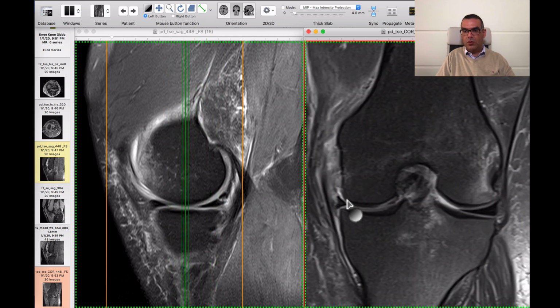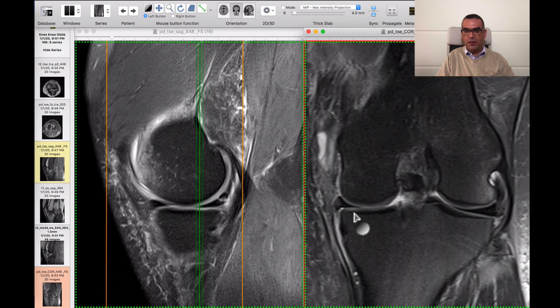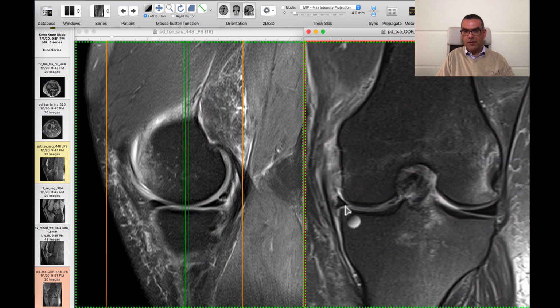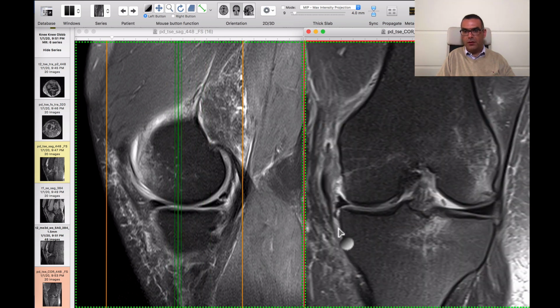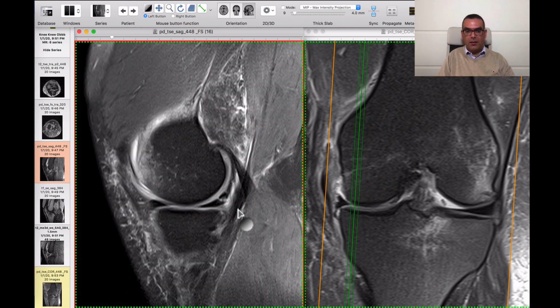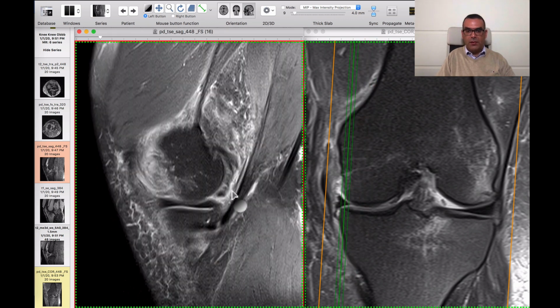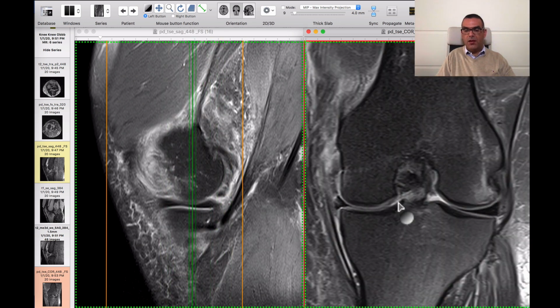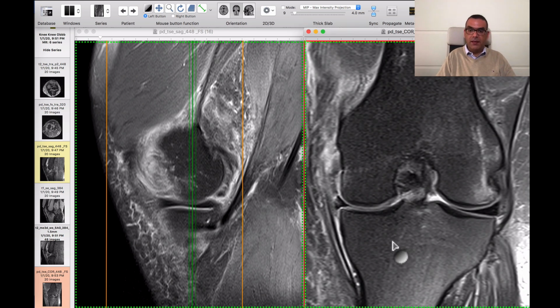And you don't see the meniscocapsular attachments of the body very well, especially the superior one. So there is an abnormal signal at the meniscal body. This is the inferior meniscocapsular ligament. The superior one is ill-defined, we don't see it, and this is an oblique horizontal tear at the base of the posterior medial meniscus. This is associated with torn meniscocapsular attachment and this small displaced meniscal fragment, of course. So this is a very difficult meniscal tear to identify.